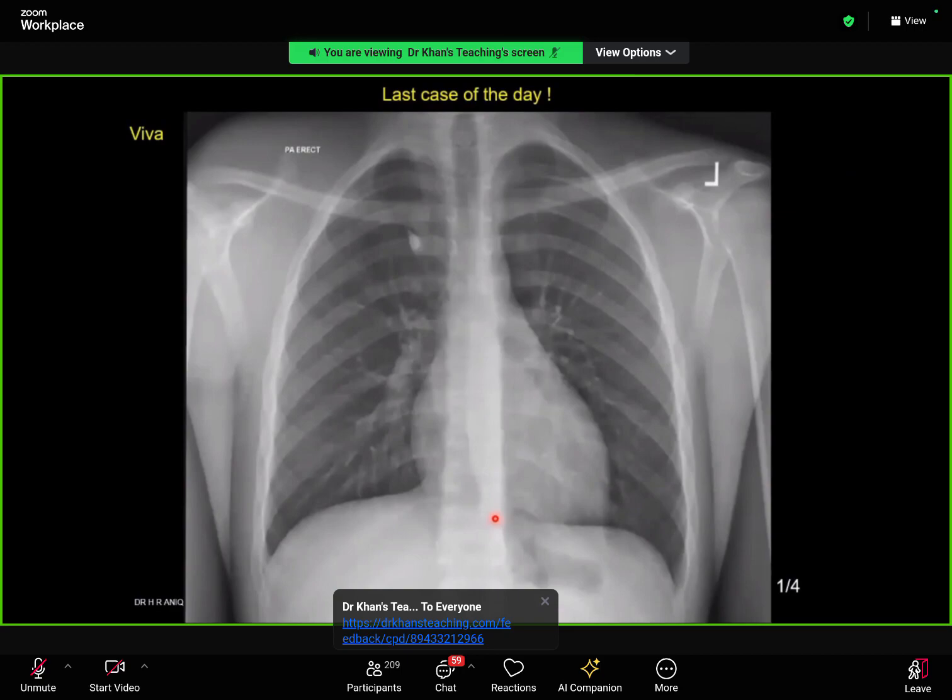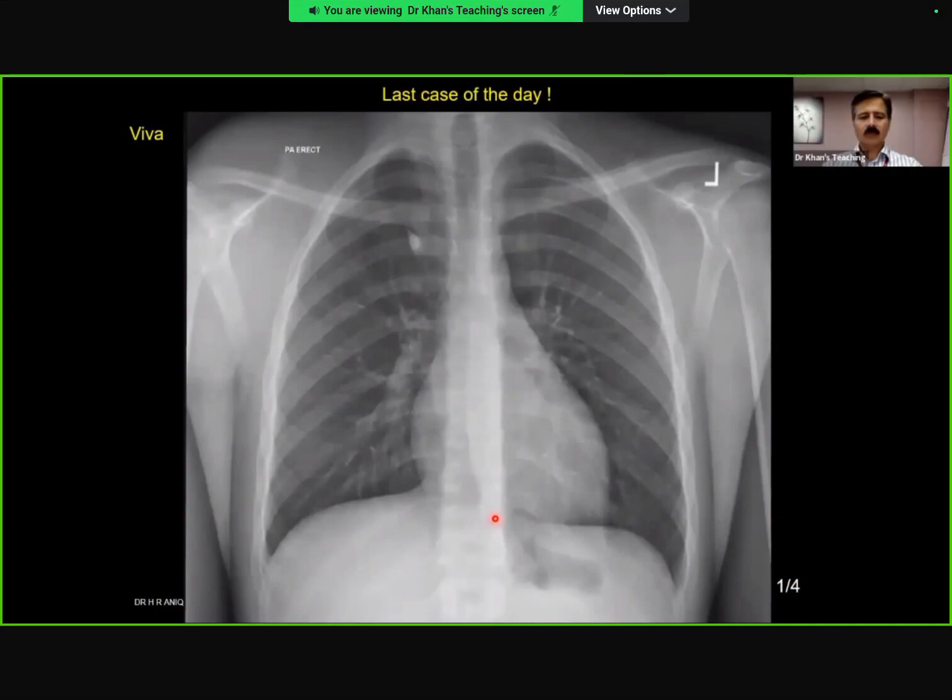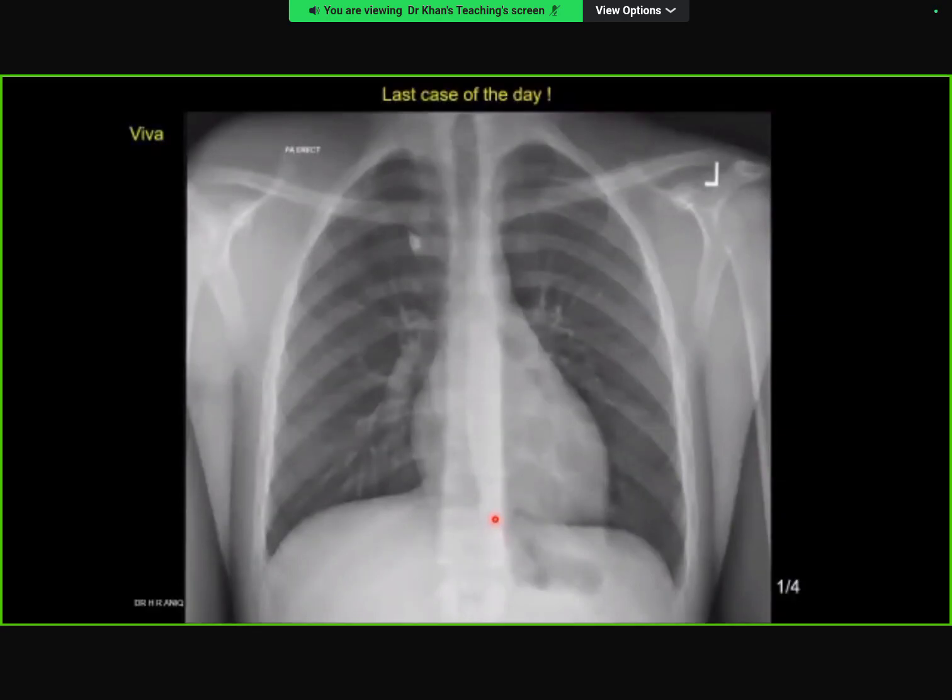In the right, projected over the right clavicle, there's increased soft tissue swelling compared to the contralateral side, so it looks quite expanded. The actual bony clavicle doesn't appear to have any associated erosions. So this may be a soft tissue lesion of the right.